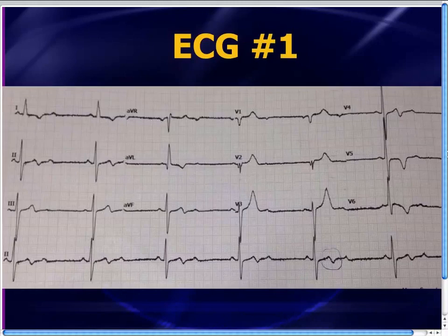The patient does have some concerns here, and one of the things that Dr. Al-Kashmiri circled is the biphasic T wave down there in one of the inferior leads. Now, we've talked before about how when you have biphasic T waves in the mid-precordial leads, V2, V3, maybe V4 also, that's something that we typically refer to as Wellens sign, Wellens syndrome, those biphasic T waves, or frankly, inverted T waves in those leads. You're going to need to worry about proximal LAD occlusion.